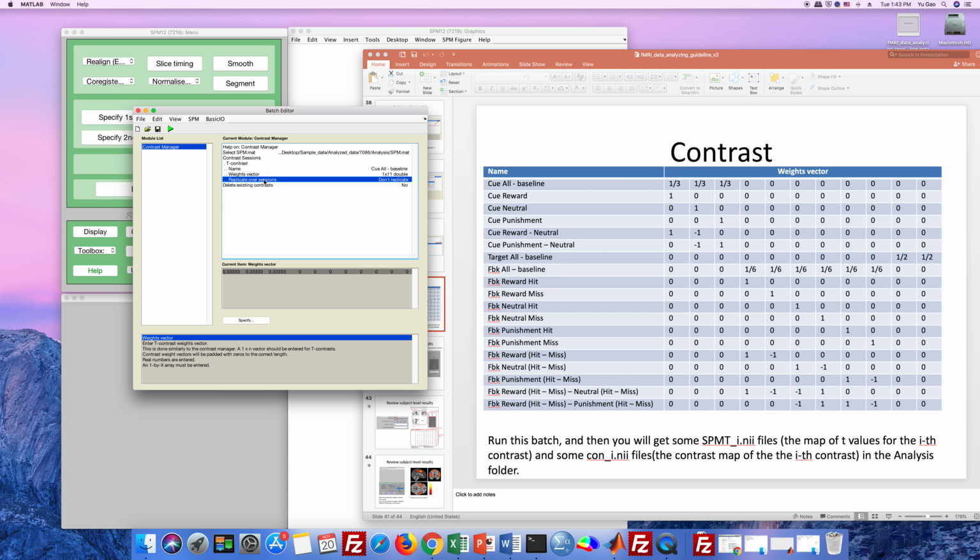Done. And for replicate over sessions, we choose replicate and scale. This means you don't need to define run 1 and then run 2 specifically. You can define just one run. And here you can select delete the existing contrast if your purpose is to define all new contrasts, not just to add a new contrast. So we finished the first one.